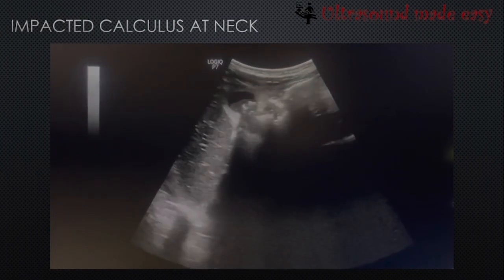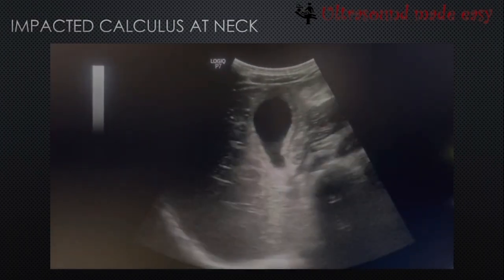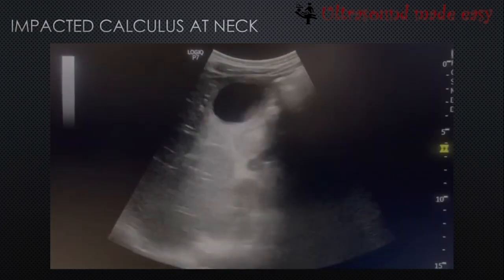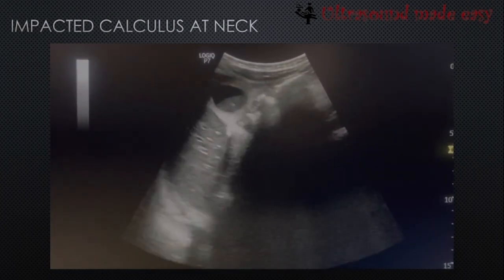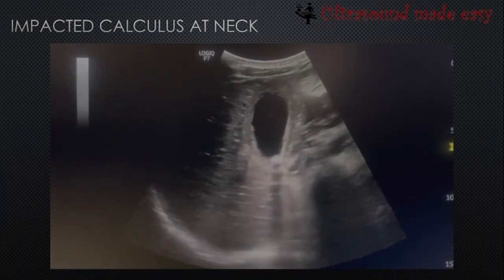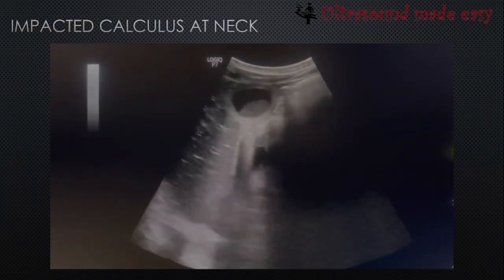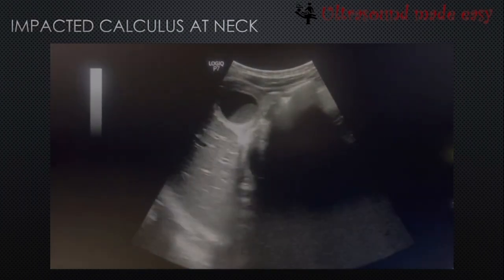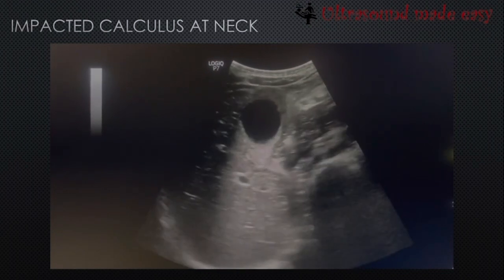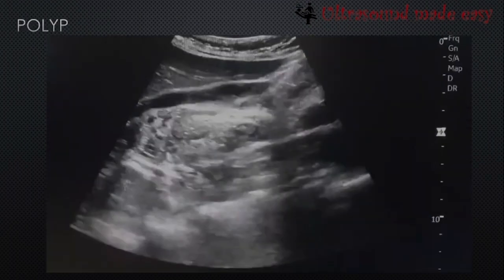These are not uncommon findings; these are very common. The point to remember here is that whenever you find a distended gallbladder, look at the neck very carefully. The possibility of finding a calculus at the neck is higher in such cases.